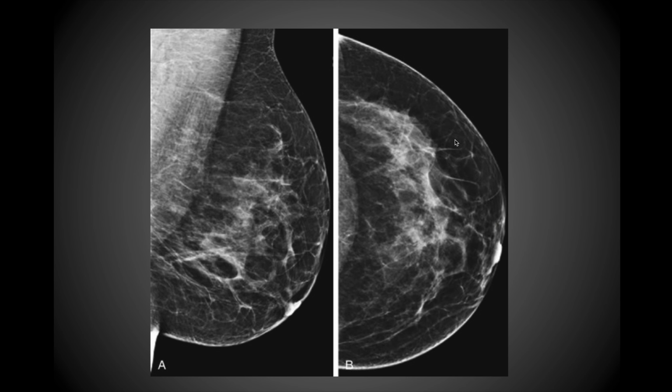And so the image on the right represents what we call a cranial caudal view. That's where we're looking down on the breast, so you can see the nipple here on the right hand side, and then you can make out the ducts as well as the suspensory ligament. All of these wispy structures that you see through here represent Cooper's ligaments that are supporting the breast. And then this one right here is a medial lateral oblique view of the breast.